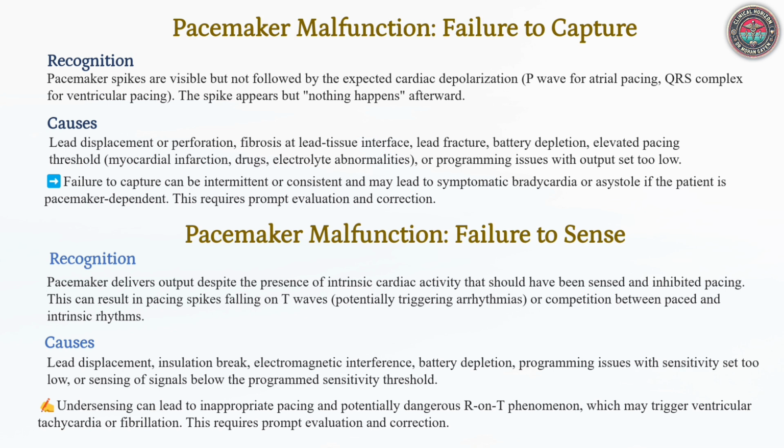Pacemaker malfunctions. Failure to capture. Failure to capture occurs when pacing spikes are present but fail to elicit cardiac depolarization, resulting in absent P waves, that is atrial pacing, or QRS complexes, that is ventricular pacing, after a spike.